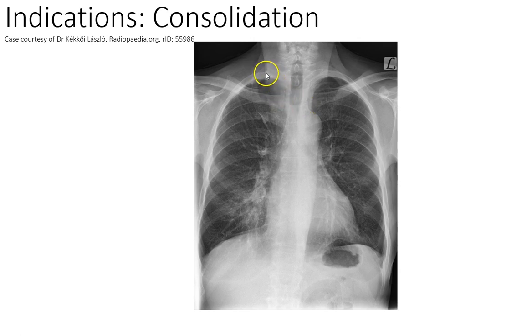So I'm now counting the ribs down, and I'm counting 1, 2, 3, 4, 5, 6, 7. Lovely. And so the 7th ribs are bisecting the hemidiaphragm, so there's no collapse of the bases. The angle here is nice and crisp and clear. The hemidiaphragm isn't too bad either, but this angle is really quite messy. It's not clear. It's much less distinct. Okay, and on the other side, it's nice and crisp and clear.